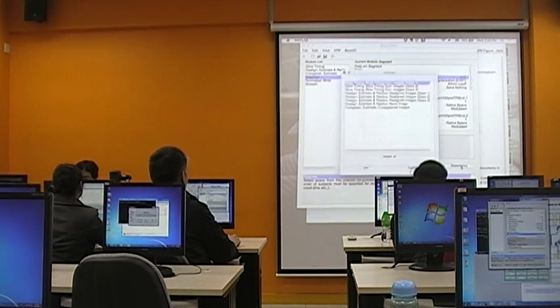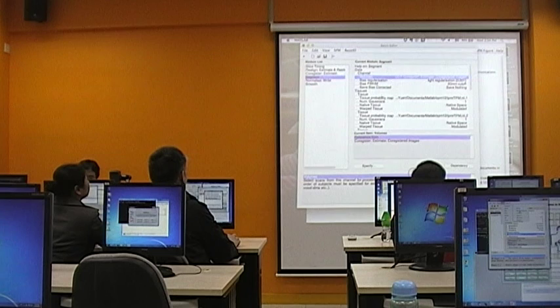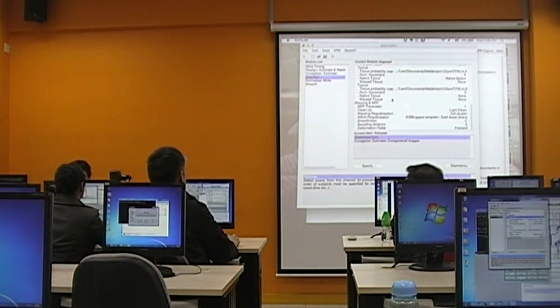I'm also setting up a dependency because in co-register I move around the T1 image so that the output of the co-registration step would be a T1. So this time now I use the T1 as the input. And there are two different things you need to do.